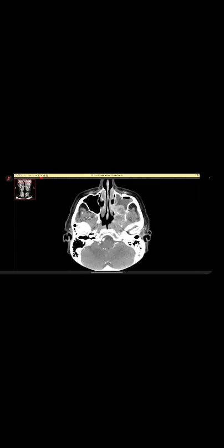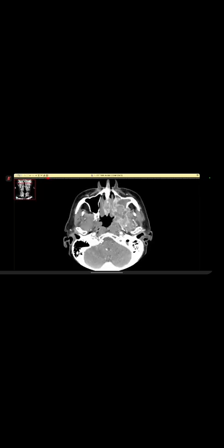CT rather. So then we did a CT scan, and this is the post contrast, and on this post contrast, the point is that you have to scroll up and down to be able to pick up everything. Now, even here, one can argue that on an axial slice, you see this is the hard palate which is eroded.